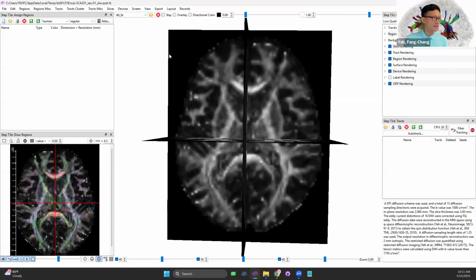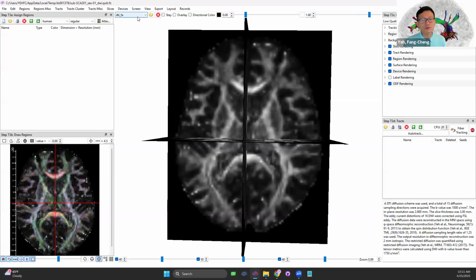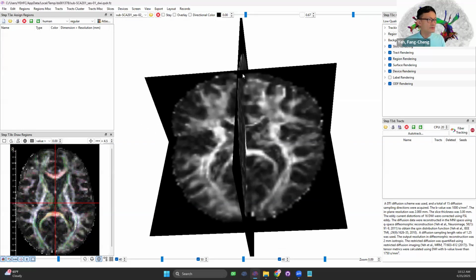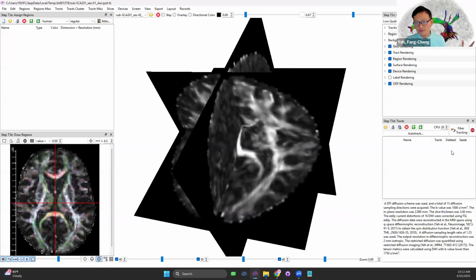You will see there's still a little bit of misalignment, but it's okay. It will be coded as a systematic error, which will tell us how to address or quantify this later. So once we have these two, usually the first step I do is just to test if the fiber tracking is okay, because sometimes there are data quality problems.